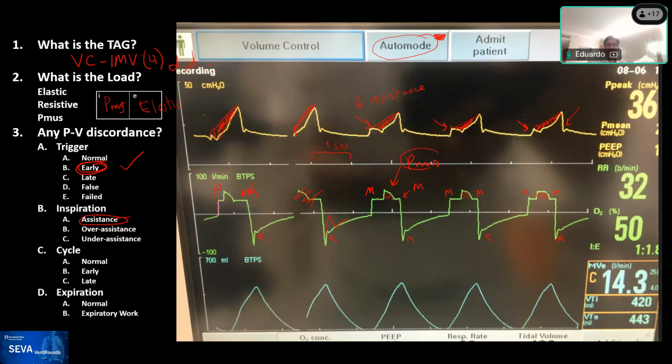I would also highlight that under these circumstances, the engineers, as you clearly mentioned, Vlad, shortened the inspiratory time to maintain the tidal volume the same. And you can see that tidal volume remained, even in the presence of work shifting and assistance, at the target that the patient had. And so this is engineering that, even though when we read this, I sometimes have a natural reaction of saying, oh, this is not volume control.